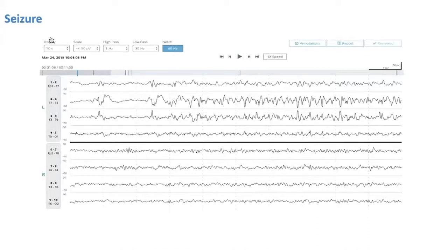And the change is a matter of the frequency, the shape, the distribution across the scalp, but it's that progression or evolution that corresponds to, in fact, what's happening behaviorally with the seizure manifesting in different aspects across the seizure occurrence. And so watching for this change is helpful. But the features of change are discernible. They're clear. We have an idea of what they are. And this, of course, is helpful for quantitative methods, computational methods, to identify seizures through artificial intelligence.